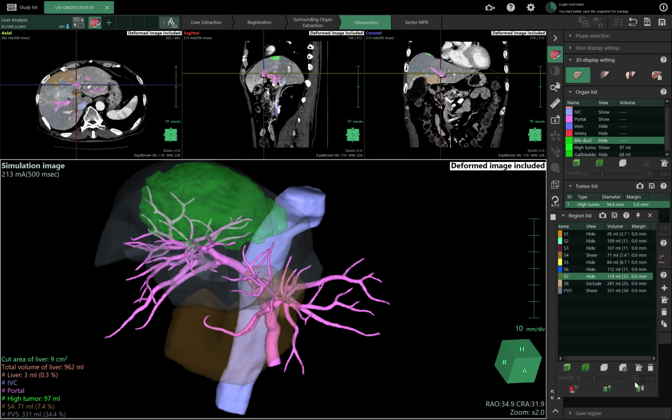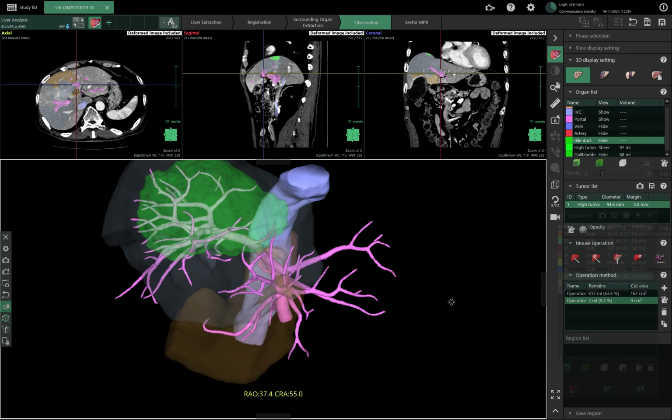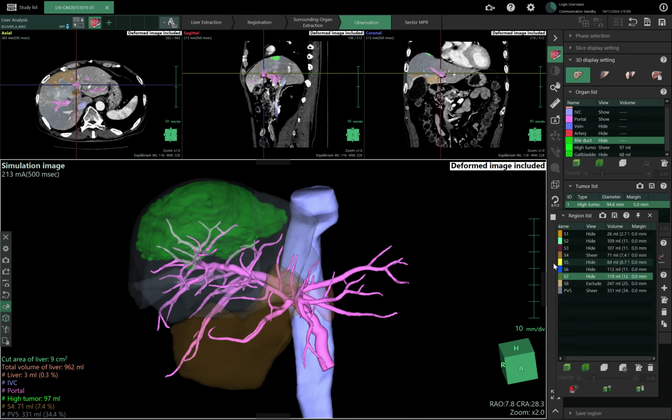So then this, in the liver as in the lung, is quite complex because it's usually planned regarding the vessels, regarding the veins. Usually it is the portal vein that they use for the extractions. And in some other cases it is suprahepatic, but it depends on the approach they are going to take for the surgery.